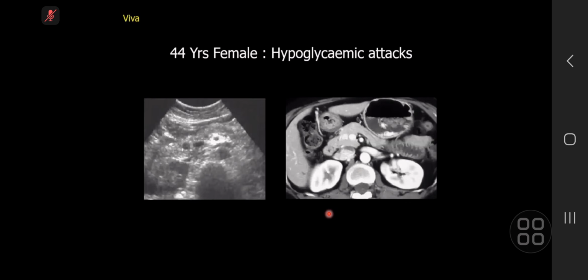an abnormal hypoechoic rounded lesion within the head or at the junction of the head and body of the pancreas. There is no significant ductal dilatation that I see on ultrasound. On the contrast CT, just where the normal vessels are at the junction of the head and body, I can see another hyper-enhancing area, rounded in configuration. What is your conclusion? Well done.